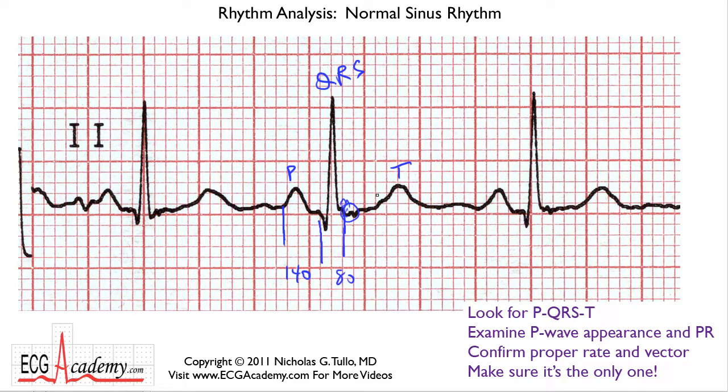And the QT interval, of course, we measure, and you can count the corrected QT as normal or abnormal. It looks normal because it's less than half the R to R interval, as we discussed in the previous section. But what about this P wave? Remember, if I had just looked at this P wave, I would say, well, what the heck is this little jiggle here? Is that the P wave? Well, you can see that that jiggle is absent in this beat and it's absent in this beat. So it's noise. It's high-frequency noise. The patient maybe moved around just for a fraction of a second. So you really kind of have to scan across and see what your favorite P wave is.